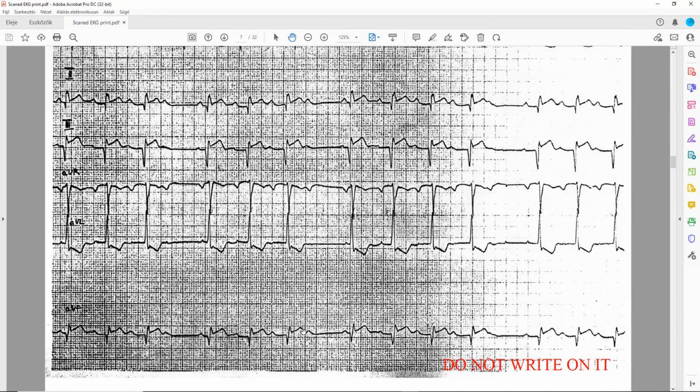This is what we are interested in, not the pathomechanism of why the ST elevation develops. It means that we have an inferior necrosis plus an ST elevation, a sign of lesion, so that's an acute inferior myocardial infarction. That's it. Okay. All right. Good.